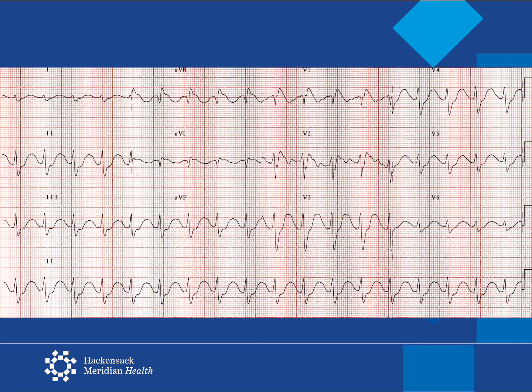This almost looks like a Brugada, but it also has a very long, prolonged QT interval. It has wide QRS, prolonged QT interval. This is actually a tricyclic overdose. Prolonged QTs can be strongly suggestive of various overdoses, and tricyclics are one of them.